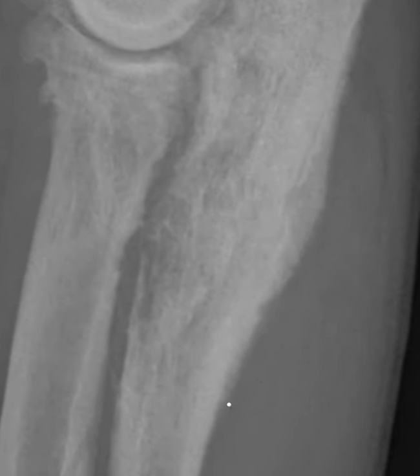Last week I talked a little bit about when I trace a periosteal reaction, if I'm going along the long axis of the bone more than I'm going up and down perpendicular, I tend to call it smooth. Maybe you can see that as I zoom in, if I'm really tracing the edge of this periosteal reaction, I actually have to follow quite a few little craters and divots, as well as some areas that are kind of pointed outwards.